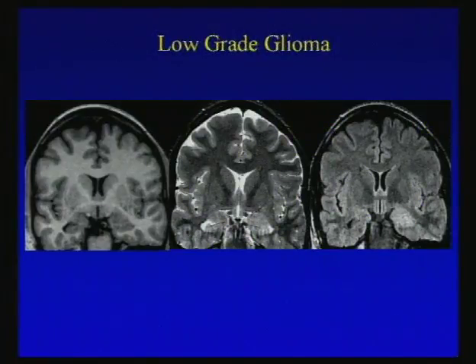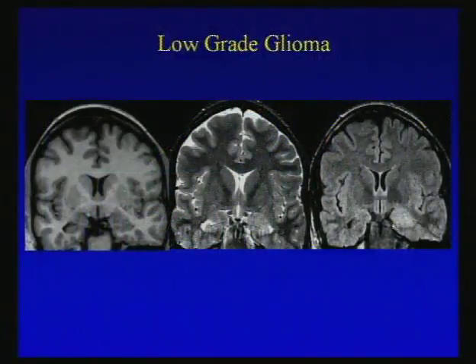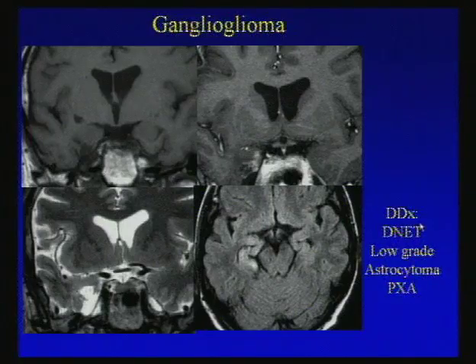And you may say, well, could this be a hamartoma? Well, you really shouldn't see enlargement of these structures. So we'd certainly do short-term follow-up. As we've done in this patient, we follow this patient very carefully. And this patient hasn't gone to the OR to resect this area because this is eloquent brain. The medial temporal lobe structures control memory, and in certain patients you may see a very severe memory deficit if we were just to remove the hippocampus and adjacent structures.